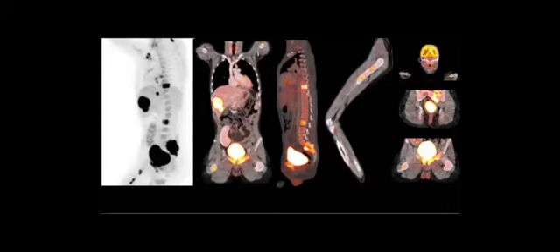It can be a primary bone tumor, then you will think what it could be. If you mention the sacrum as a primary mass, what could it be? Yeah, it can, but I will ask you a question. Do you think that chordoma can metastasize like this? Do you see it as regular, typical? It's not typical, right? You agree? Marwa, good differential. Ewing.